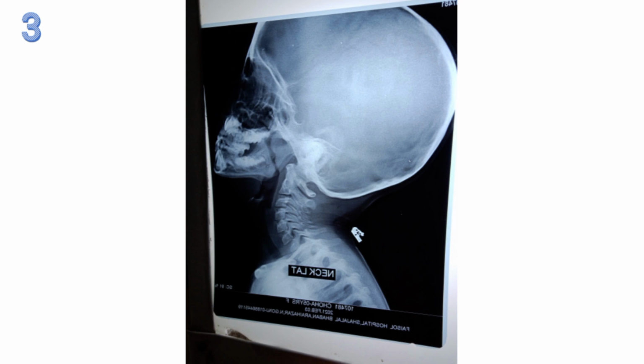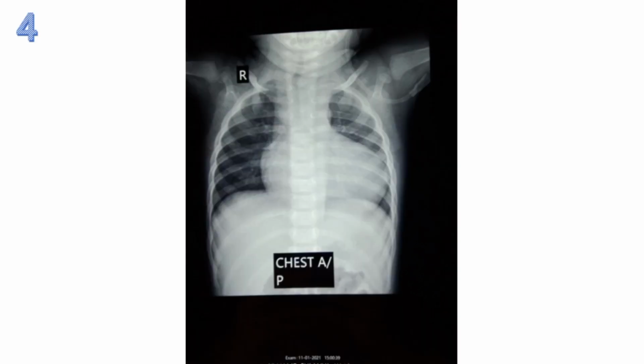X-ray nasopharynx shows enlarged adenoid, which gave pressure to air column, causing thinning like a thread. There is obvious cardiomegaly, which should be confirmed by measuring cardiothoracic ratio, and the DD may be heart failure, pericardial effusion, or cardiomyopathy.